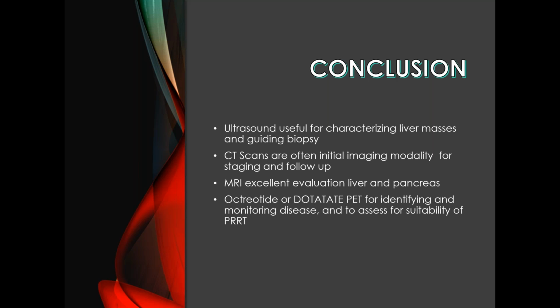Yeah. So again, keep in mind that when you have small nodules, like little tiny nodules less than a centimeter, like 2, maybe even 5 millimeters, they really are better assessed with follow-up CT chests. And based on the size, there are specific recommendations for the clinician in terms of follow-up, say 3 months or 6 months or 1 year. The thing is that with your PET scan, you don't have as good resolution and there's breathing motion artifact, especially in the lower lungs. You might not be able to accurately say whether or not there's true FDG or DOTA-TATE uptake. So you have to be careful there.